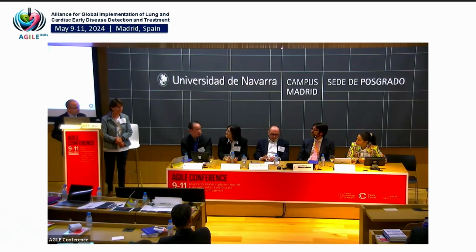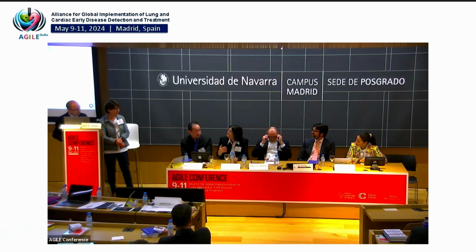Yeah, and I think the US context is probably different, with the high prevalence of small airway disease in individuals who are actively smoking cigarettes or most recently did. With small airway disease, such a small focus, we would consider that a negative screen with Lung-RADS. Of course, if there's patient symptomatology, that might change the picture, but in an asymptomatic patient, it would be continued screening in a year. We see these come and go all the time. So you do not follow up at 3 months, but next year. Negative screen.